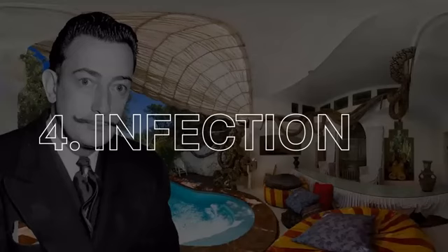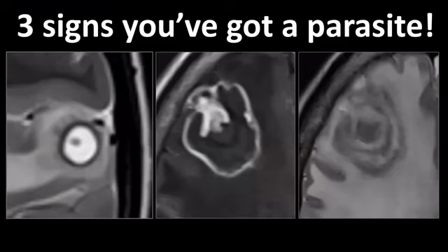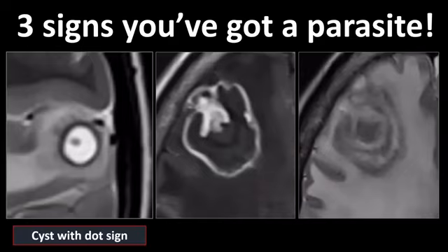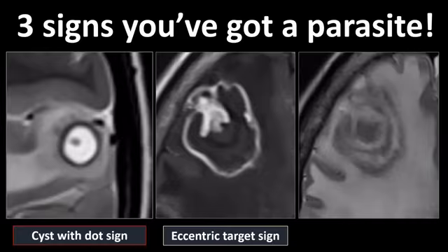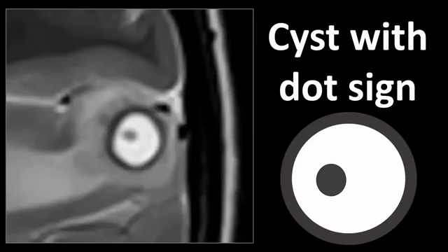And this brings us to infectious disorders of the central nervous system. Also here, we're going to discuss several imaging signs. Here are 3 signs that prove you have a parasite in the brain. We have the cyst with dot sign, the eccentric target sign, and the concentric target sign. Let's examine these signs in a bit more detail, and let's start with the cyst with dot sign.